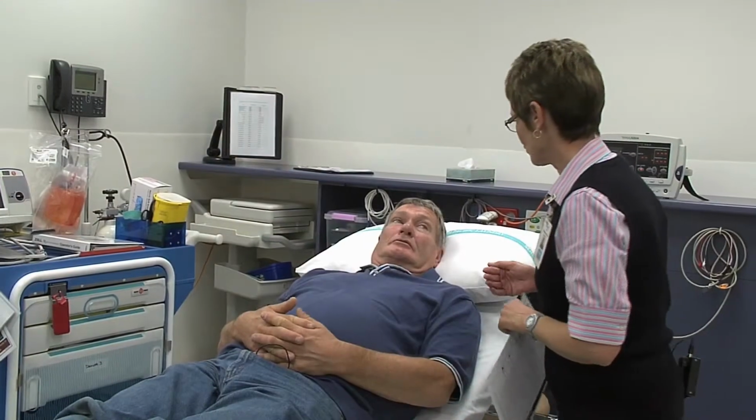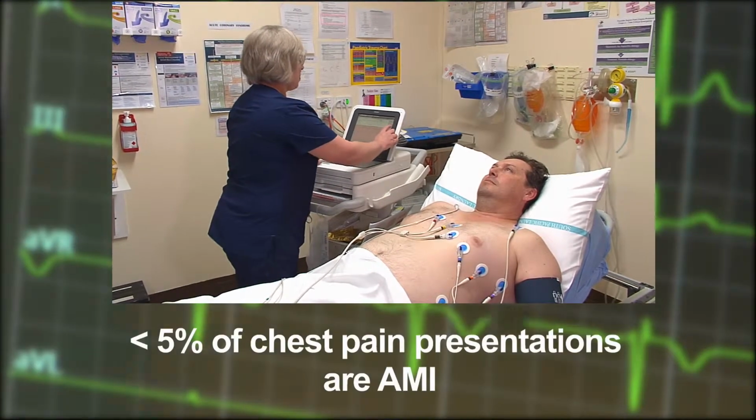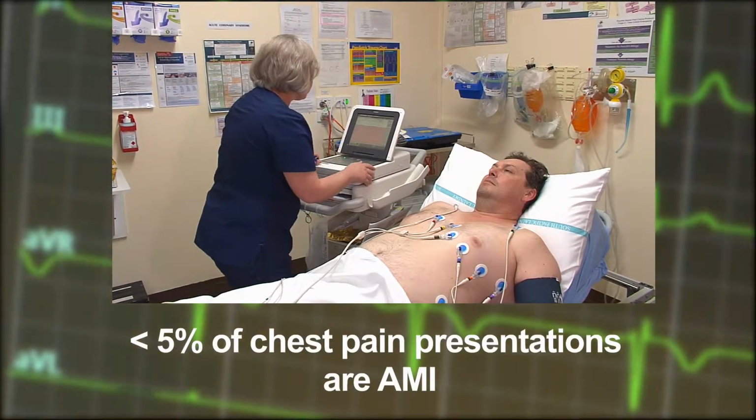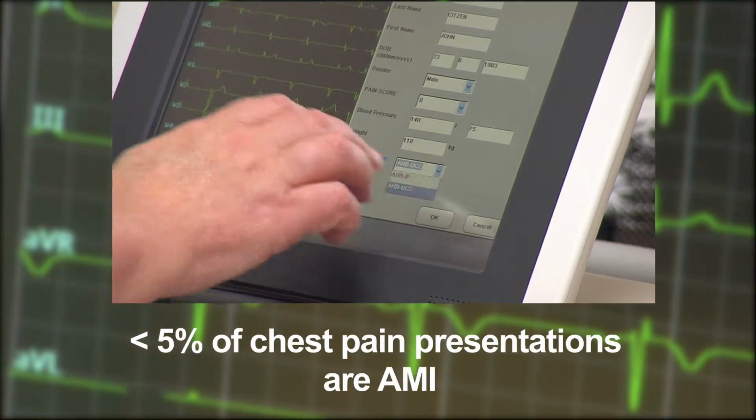You'll commonly get phone calls from GPs asking for advice about what to do about this person with chest pain, what to do about this ECG, oh my God, do I need to thrombolyse this patient who looks like they're having a STEMI? Using this system is a way of supporting both them and yourself so you can see what's going on.